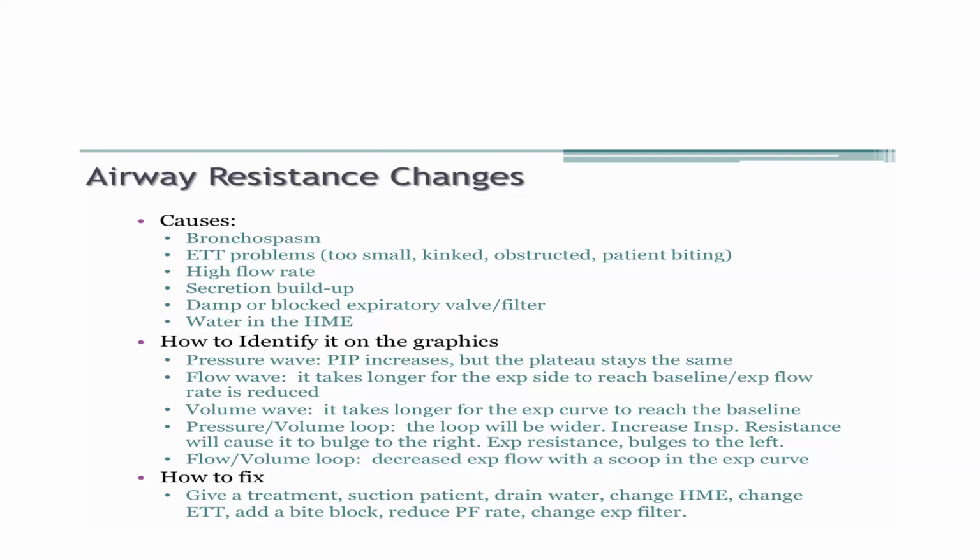Now, how to identify the pressure wave? Peak inspiratory pressure increases, but the plateau pressure stays the same. In the flow wave, it takes longer for the expiratory side to reach baseline and expiratory flow is reduced. In the volume wave, it takes longer for the expiratory curve to reach the baseline.